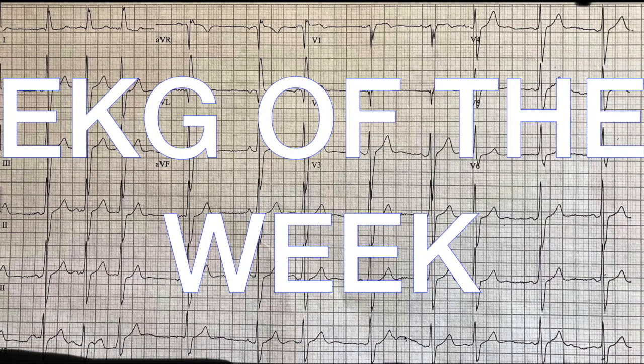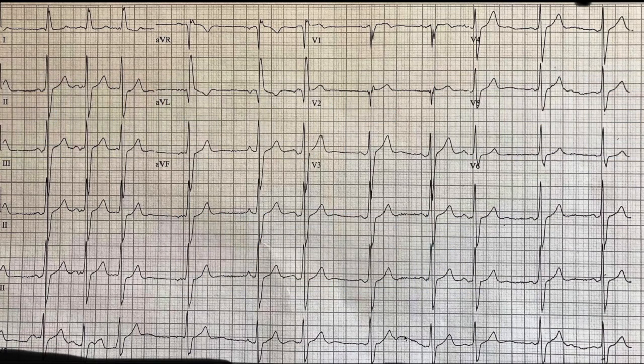EKG of the week. Let's walk through another real-life EKG. This one is just a little bit tricky. It might be a little bit subtle, but we will work our way through it here. So as always, go ahead and take a few minutes, pause the video, take a look at this EKG, and come back when you have an interpretation.